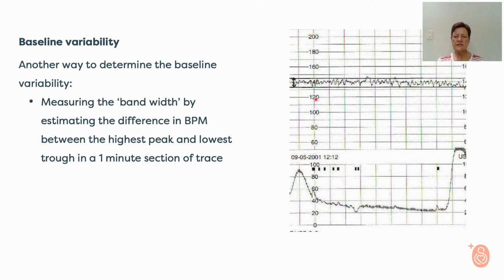And here you can see it on this slide. If one literally draws a line at the bottom of the fetal heart rate here and at the top of the fetal heart rate there, then it's very easy to see the bandwidth between which the fetal heart rate varies. Here you can see there's 120, there's 130, so this is just above 130.